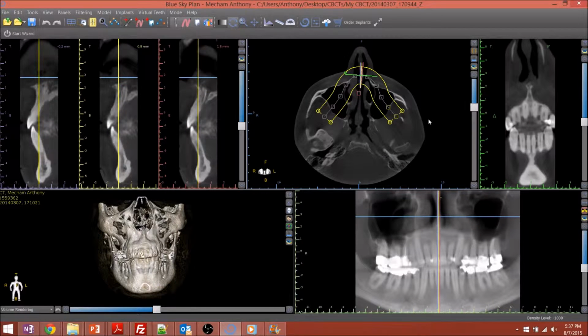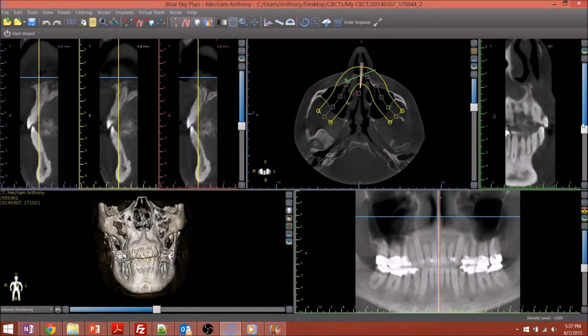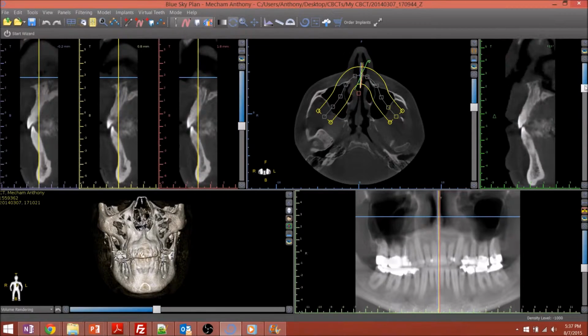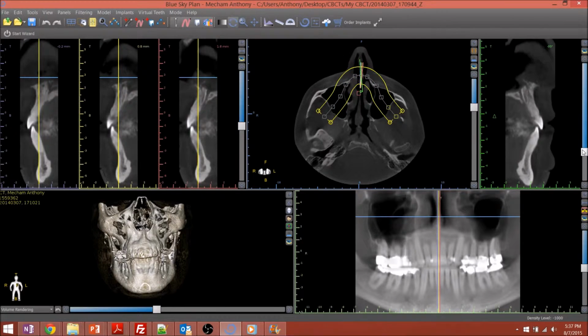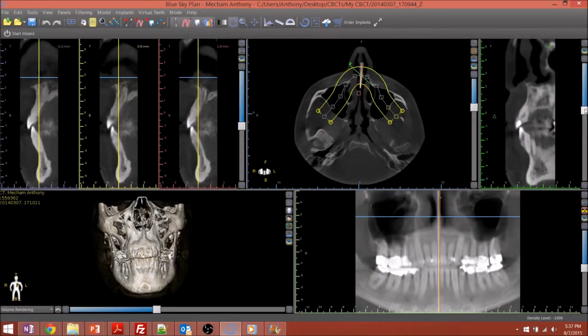This is kind of the default view. You have implant tangential 3. So you have 3 cross-sectional images, you have an axial image, and you have this custom slice right here which you can rotate by pulling this bar up or down. And that's really nice for implant planning. You pull this around 360 degrees around the implant, you can make sure that it's completely encased in bone.